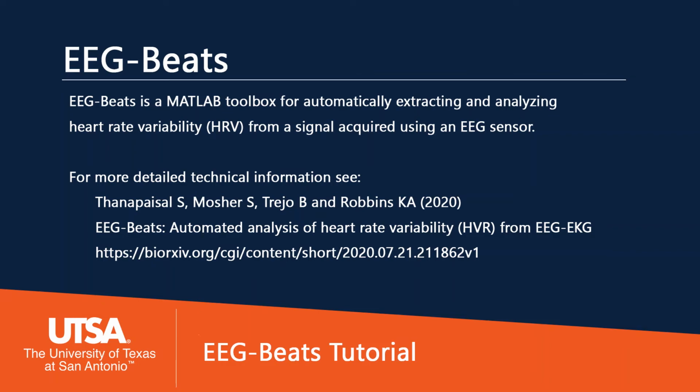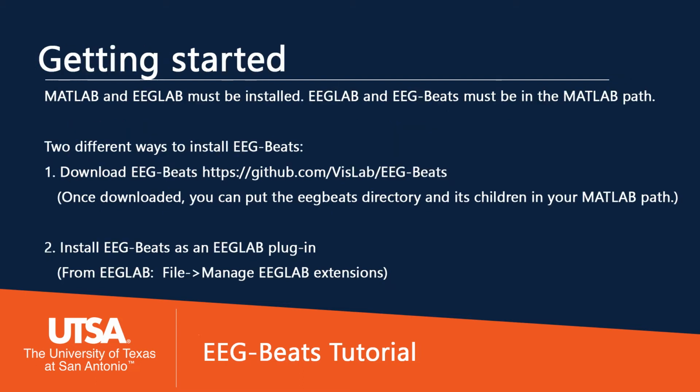EEG Beats is a Matlab toolbox that extracts and analyzes heart rate variability from an EKG signal. You can read more about the technical details in this article. Please make sure you have Matlab and EEG Lab installed before continuing.